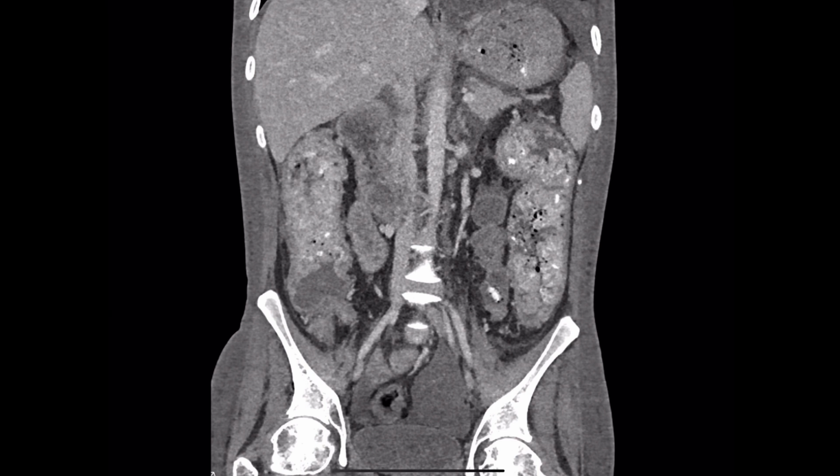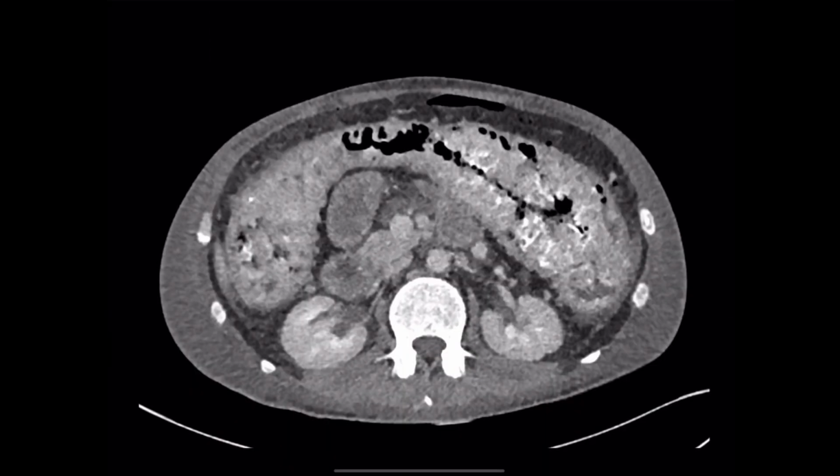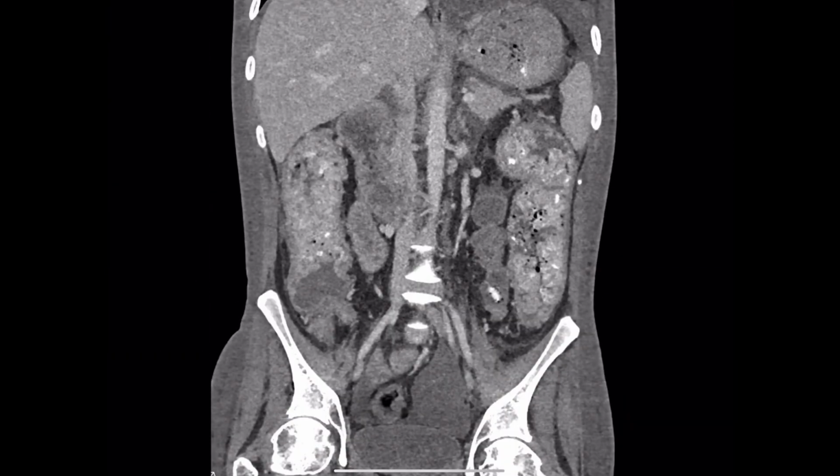Okay, so earlier we talked about what an inflamed colon might look like. Things can get worse, Colin, much worse. And I think a similar scenario is playing out here with perhaps a complication. There is. We actually have two images here. We have an axial image here and a coronal image here. Okay. And this sort of leads on from the previous abdominal X-ray case where there was bad dilatation.